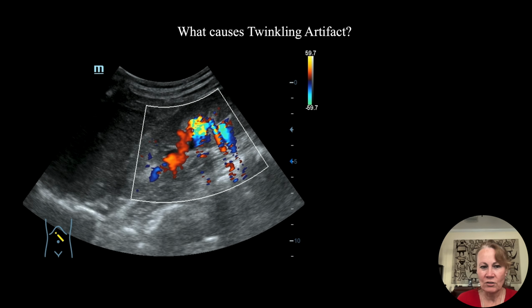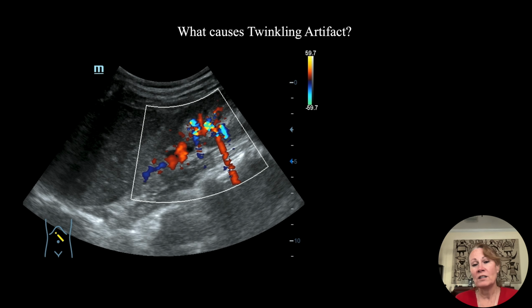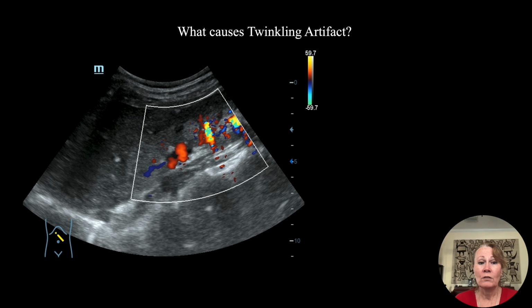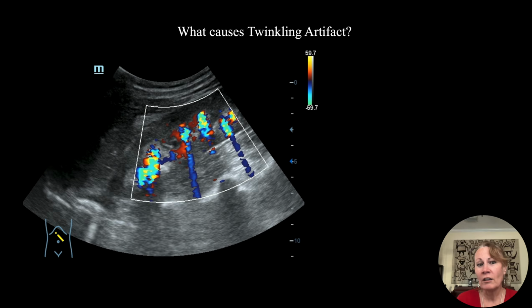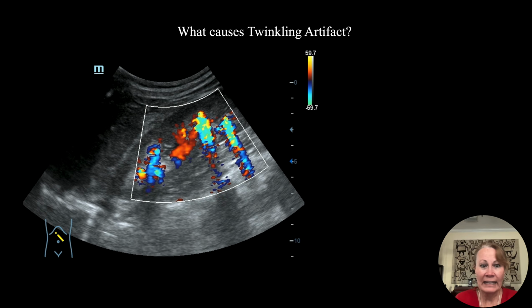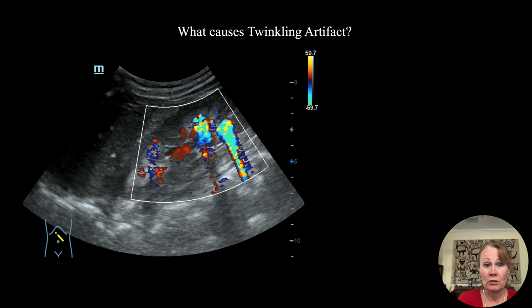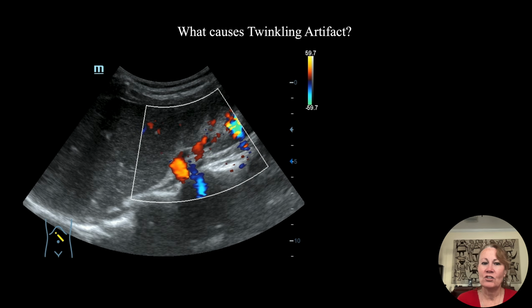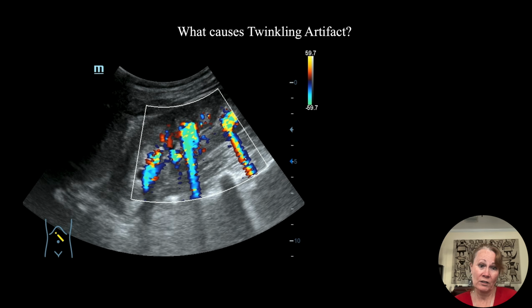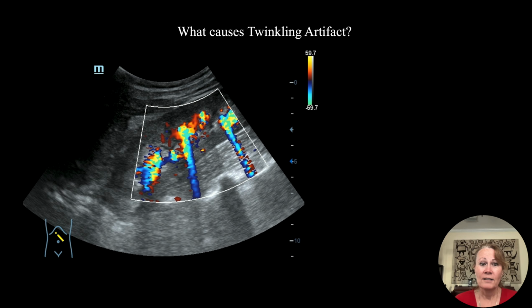And just during that color Doppler, when the noise is generated and the noise interacts with the strong reflector of the calcium, it causes this Twinkle artifact. It causes the machine to take that interaction and register it as color, when it actually isn't. It's just an artifact of a strong reflector with the intrinsic noise of the color Doppler processing. So that's why we get that.